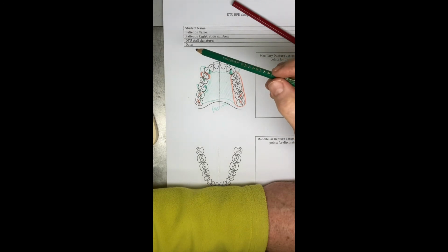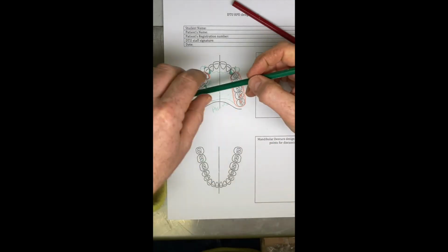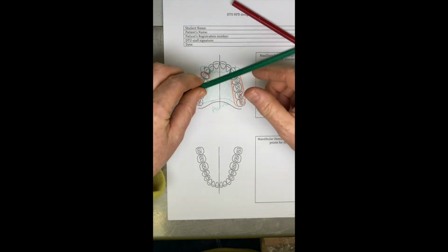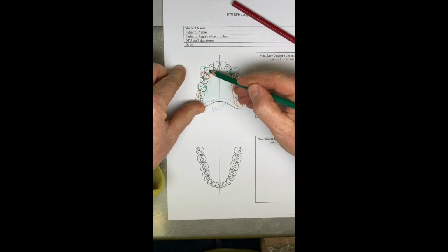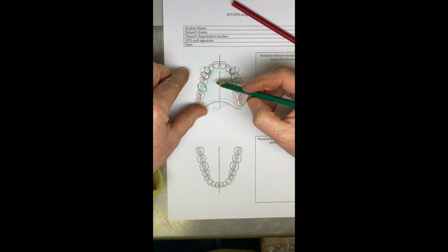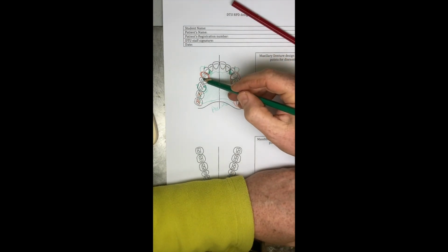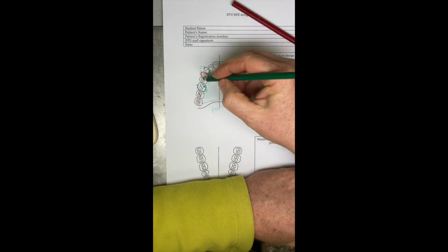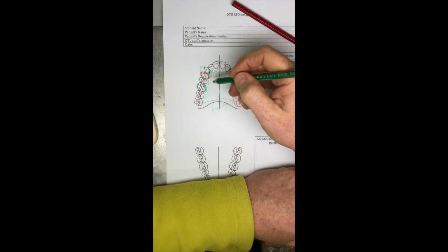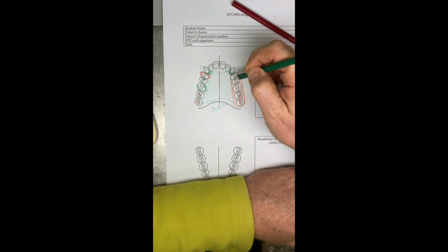Can we incorporate indirect retention? Well, if we've got our saddle area here, and we've got a clasp tip here and a clasp tip here, when we go to rotate, we're rotating about our pencil in this direction. So this cingulum rest would by default work as indirect retention. So we're all right at that point. And then the final stage, noting your prep work, rest seats, I'd probably consider deleting this occlusal rest off, or we can leave it there and have a belt and braces kind of approach.